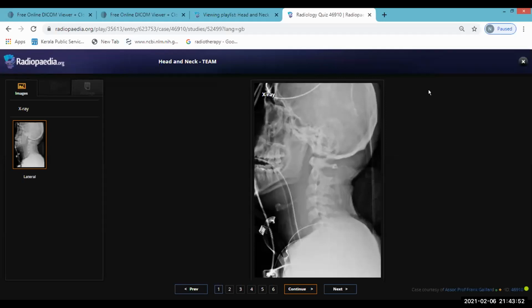Okay. I've been provided with a lateral radiograph of the cervical spine. I'm looking at the bone of the patient, and there's mild straightening of the cervical lordosis noted. No significant degenerative changes seen in the cervical vertebral bodies. I'm looking at the prevertebral soft tissue. I think there is a mild thickening of the soft tissue noted at the C2 to C4 level.